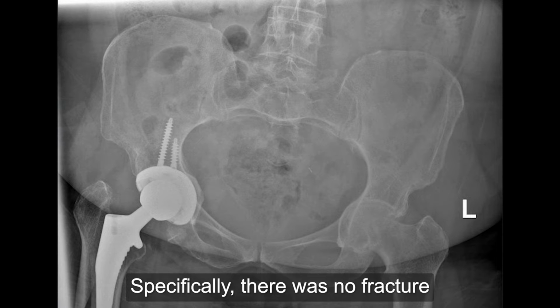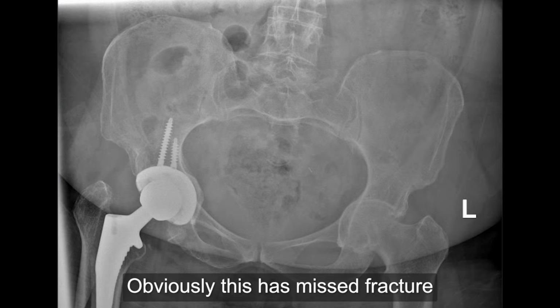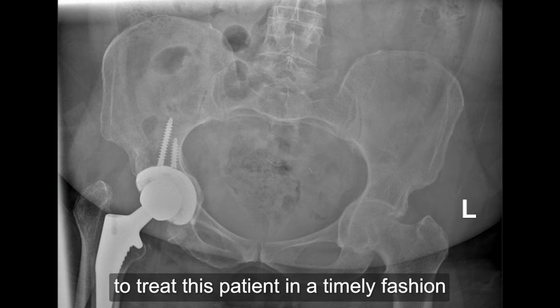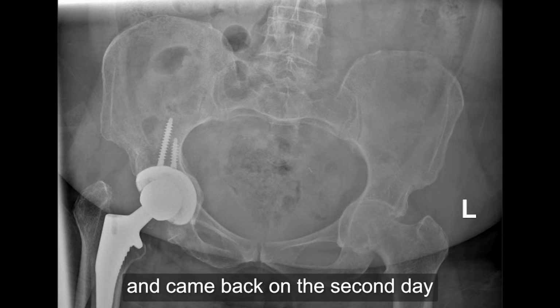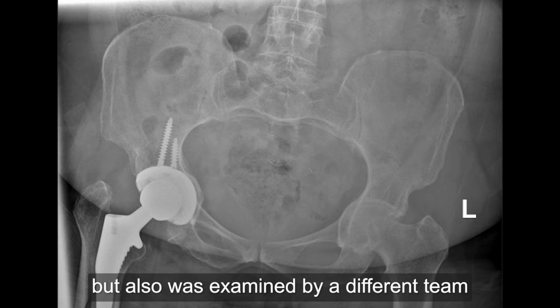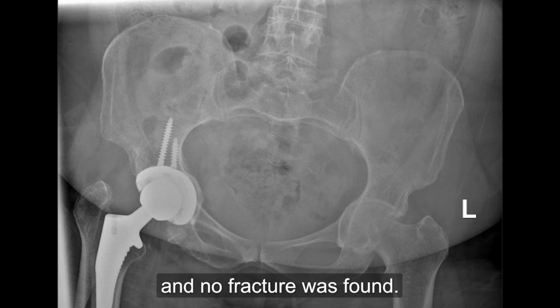Specifically, there was no fracture detected on the X-ray or reported on the radiograph. Obviously, this is a missed fracture and a missed opportunity to treat this patient in a timely fashion and avoid complication. The patient went home and came back on the second day because the pain had worsened, but was also examined by a different team and another X-ray was performed and no fracture was found.